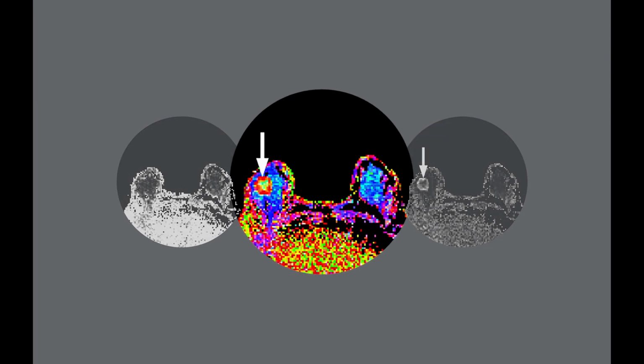At Memorial Sloan Kettering Cancer Center in New York, a group of researchers have compared MDD to conventional diffusion MRI methods in a breast cancer setting. While the image from the conventional scan does not reveal anything special, our MDD methods allow for tumor detection and for the study of the tumor's inner structure. For example, the inner structure of this tumor in particular can be intuitively read from the contrast color coding. Red indicates a shell of elongated cells surrounding a core of densely packed round cells, or necrotic tissue, in green.